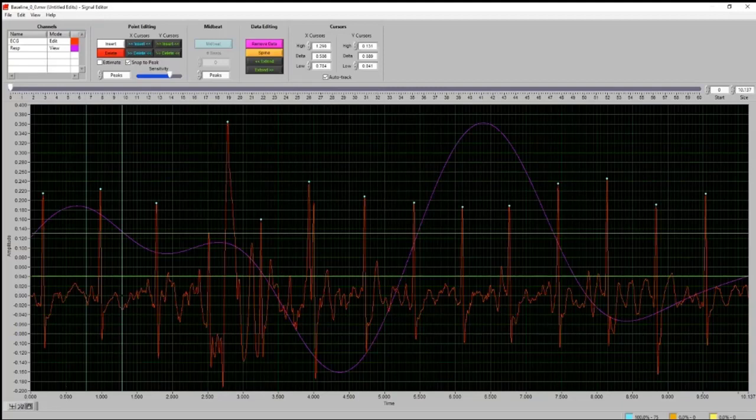So as we move through the data, I have some messy data here that is actually going to be helpful for us to edit. And so we can see structures within this noise, which is likely a motion artifact. So they tugged on the lead, they touched the sensor, they stood up, something occurred in which the actual surface electrode was moving against the skin and caused a brief interruption in the signal, or what appears to be. And if we look closely, especially to a trained eye, we can see the actual QRS complexes. Maybe the P and the T wave are distorted because of the movement, but we can usually still see that actual QRS complex, and that's what we're after.